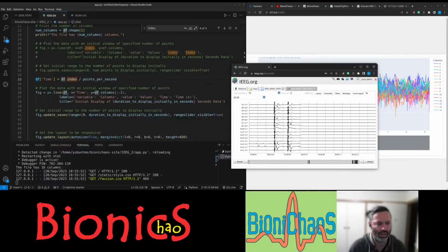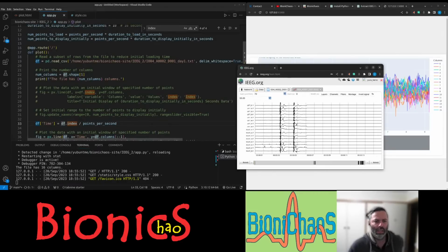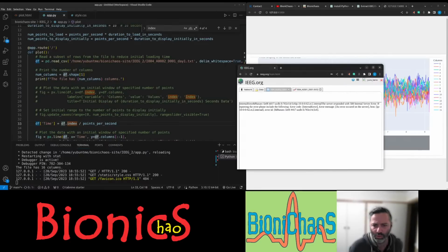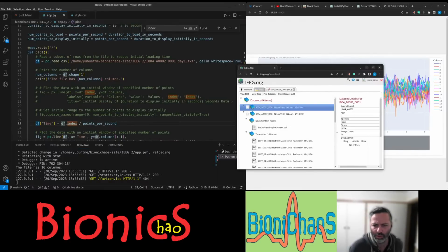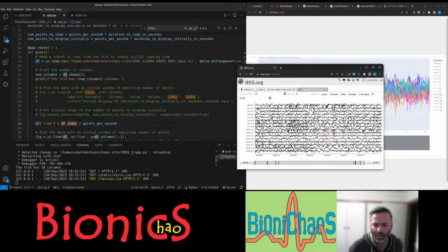Check the file name. That's definitely A02. Right. Okay, I did something incorrectly before.